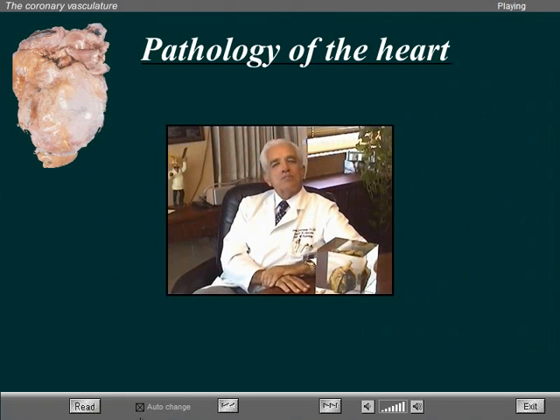Now we're going to show you examples of pathology of the heart: myocardial infarction, ventricular aneurysms, intracardiac thrombosis, septal rupture, mitral calcification, and intracardiac filling defects.